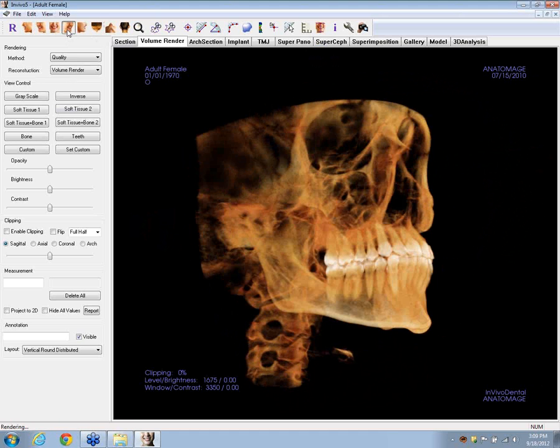This can help us. You can set up a view that you want to come back to time and time again without throwing off the section tab. We still have straight on in the section tab here and deviate from it just for this view.